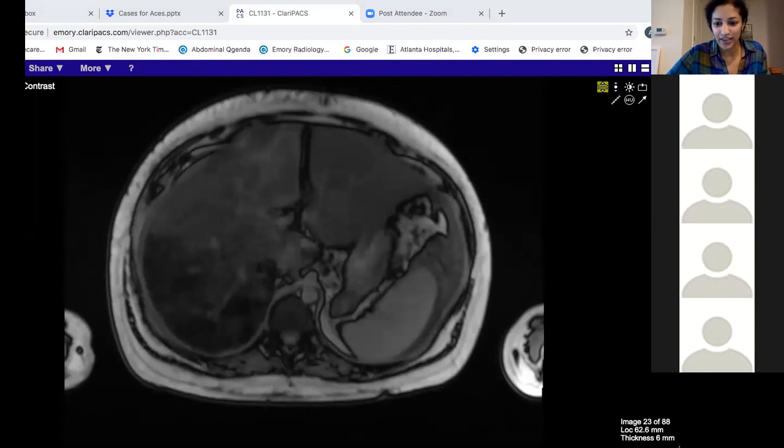Question, how much did that sat out on T2? It's probably getting close to 50% given the CT attenuation. That's true. I don't have the T2 here, but especially when you're getting severe hepatic steatosis, we'll start seeing saturation on the fat sat.